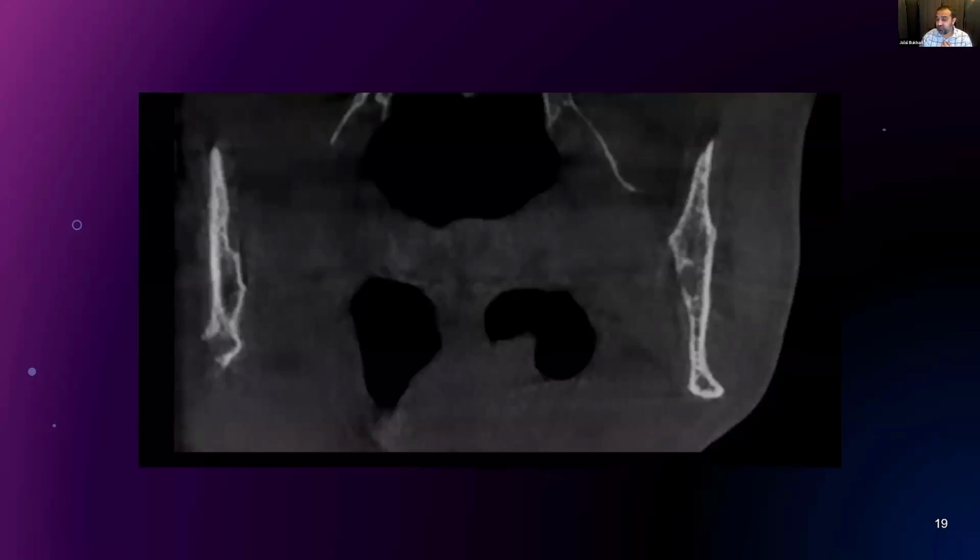Now, this is a coronal section of the mandibular rami. We see on the right side that the mandibular angle region exhibits an eroded cortex. Now, we can definitely see the extents of the erosion, but do we know where the pathology extends to once it has entered the soft tissue area? Or do we know if this is being caused by a soft tissue pathology invading into the mandibular angular region? Unfortunately, we can't make this distinction on CBCT imaging.